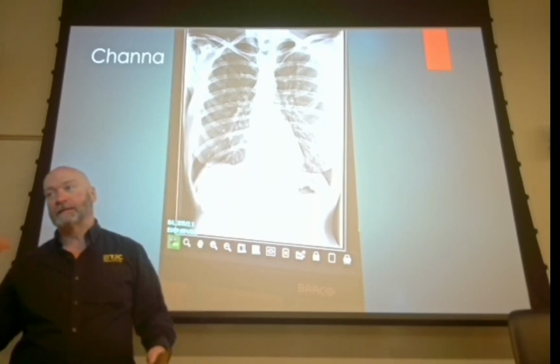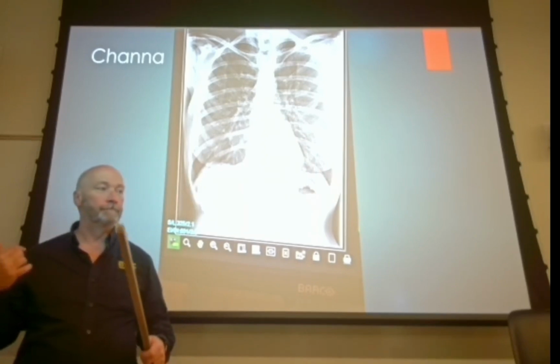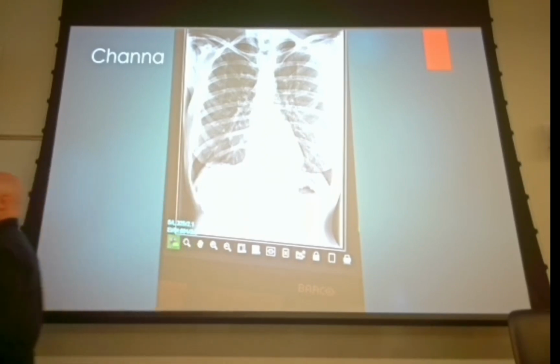So I carry in my left-hand side, I go towards my right. Okay, that's not truly scoliosis, they call it compensatory scoliosis. It's not really scoliosis, it's just that the muscles on that side have overdeveloped and caused that.